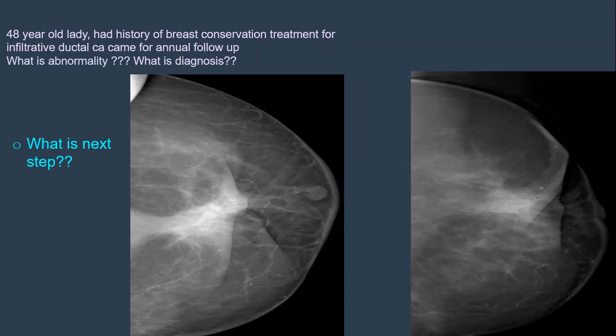You have to ask me which one is the current and which one is the previous. The previous is on the left. I did not say the previous was on the left, but it's okay. Yes, by this arrow, the left one is the previous and the right one is the current one. You have to ask. The examiner might show you the earlier one first. Make sure which one is the first and which one is the second. No problem. This is the earliest.